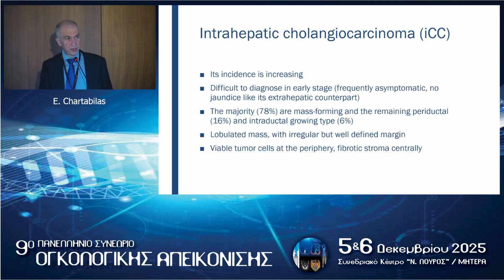Now let's move to the intrahepatic counterpart. Its incidence is increasing. Unfortunately, it does not cause jaundice, so it's difficult to diagnose in early stages. The majority are mass-forming, so you're going to look for a nodule. And it's a lobulated mass with irregular but rather well-defined margin.